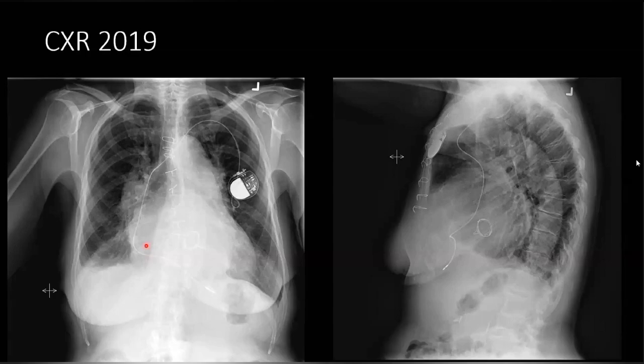Okay, and just one thing, what do you think about these lines? You missed them. These are Kerley B lines because of the pleural effusion, also blunted right. Actually, in this case, the patient now has developed pulmonary venous hypertension along with arterial hypertension. Good. So basically, the person is also in some sort of congestive heart failure, right? There's effusions as well.